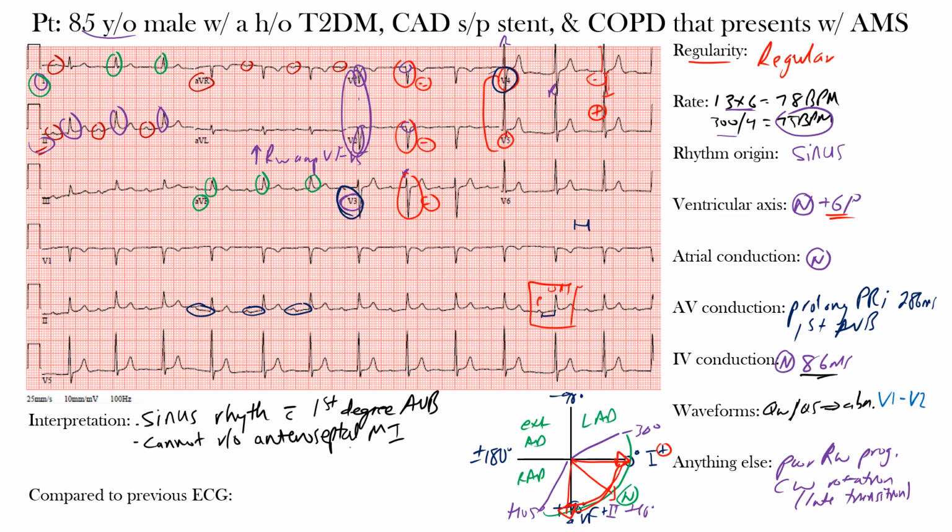Okay, and then when we compare it to the previous EKG, and that's something I always want you guys to do, the premature supraventricular complexes are no longer present. All right, and hopefully that makes sense.